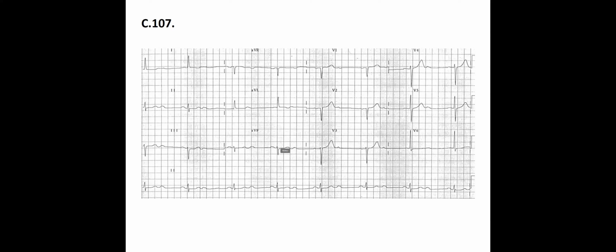No, you cannot. Based on this 12-lead ECG, there is no way, unless you do an anamnesis that the patient was taking a drug, or maybe the potassium level or other level is altered. No, you cannot diagnose it.